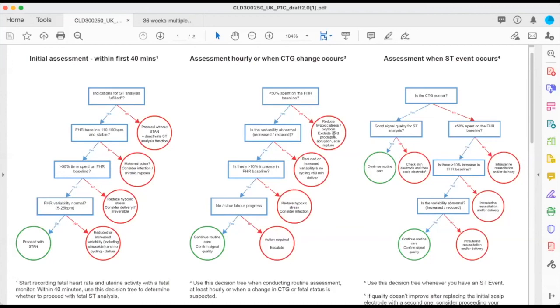And now you can set the limit to whatever you want or prefer. Be it 1 minute, be it 4 minutes, be it 10 minutes, whatever. It's what you feel clinically you need. What most people agree upon is you need 1 cross per minute. So basically 10 minutes, 10 crosses.